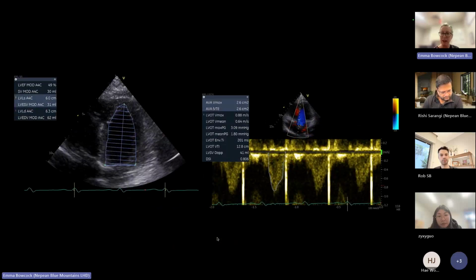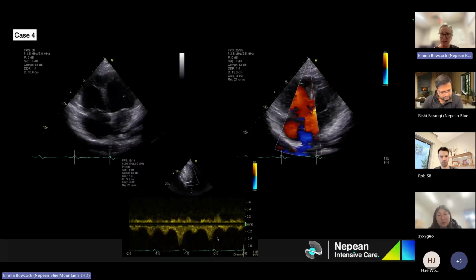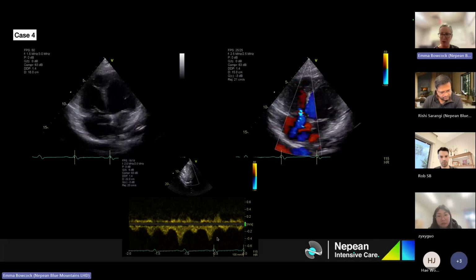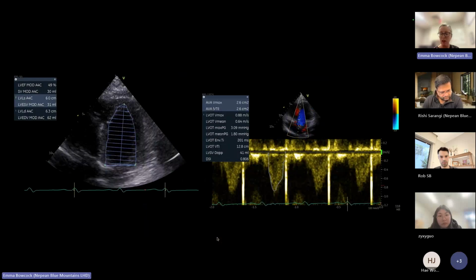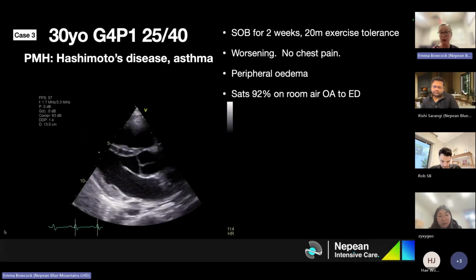The biplane is terrible, right? Because your endocardial border definition of your LV is not great. It's foreshortened. And I didn't show you all of it, I should have shown you the 2-chamber, and you could have made a bit more of a call. But the diastolic lengths were out. You can see the tracing. It's a little bit like guesswork, isn't it? So yes, look at the ejection fraction, look at Simpson's, but always critique it. And if it's not good, it's not good. Rubbish in equals rubbish out. So trust your, sometimes all you've got is your eyeball assessment.